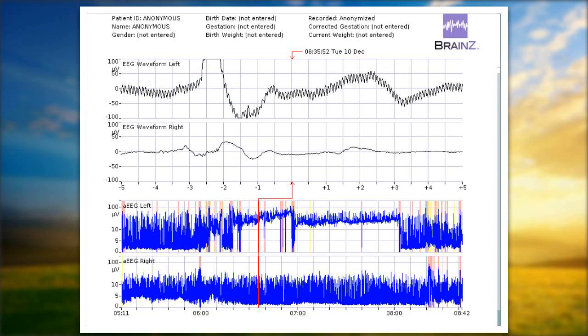This is probably because the baby is actually laying on their left side, potentially turned to the left side for this 2-hour period. And while the baby was laying on that left side, probably the electrodes were getting in more contact with the mattress, or potentially a roll that was maybe supporting the high frequency circuit and transmitting this high frequency artifact onto those electrodes, resulting in this very high voltage change in our aEEG band.